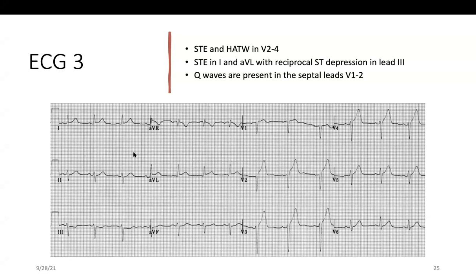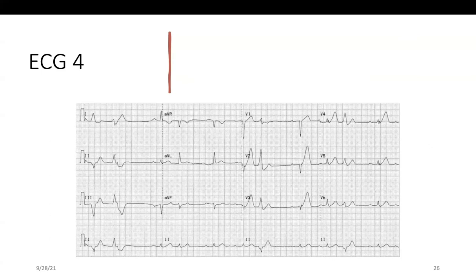Okay, as you know, I brought this ECG mainly so that you comment on the hyperacute T wave. Look at the T wave; it's bigger than the R wave and almost bigger than the S wave. Usually, the T wave is rarely more than 10 millimeters. If you count here, it's more than 10 millimeters in almost all the leads, or it's more than the R wave. And this is hyperacute anteroseptal myocardial infarction.